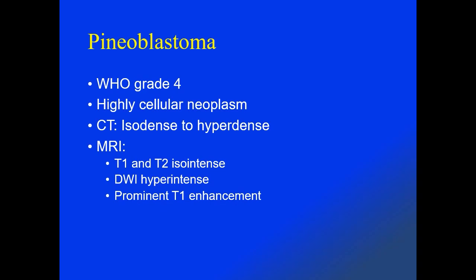Pineoblastoma is a WHO grade 4 tumor which is highly cellular and demonstrates isodense to hyperdense CT characteristics. On MRI, on T1 and T2 images, it tends to be isointense to gray matter and demonstrates hyperintensity on DWI due to its hypercellularity with prominent enhancement on post-contrast T1 weighted images.